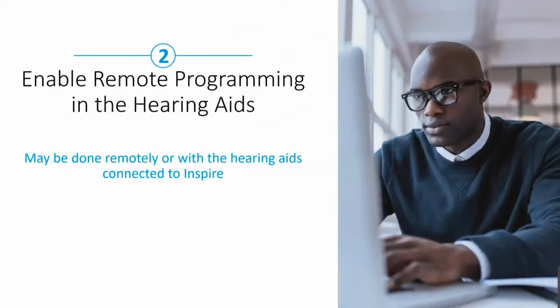Now, once the dashboard is set up, as you have patients there in your office, you must enable remote programming for each individual patient within their hearing devices. Now, this can be done remotely, or it can be done while they're connected to the Inspire software, maybe while they're there for their fitting appointment.